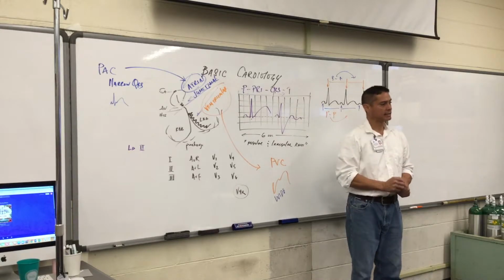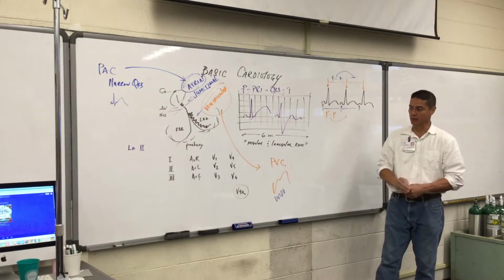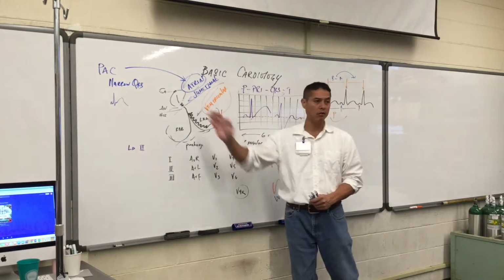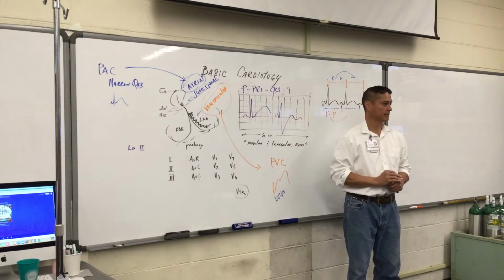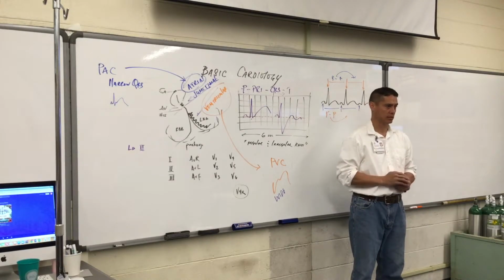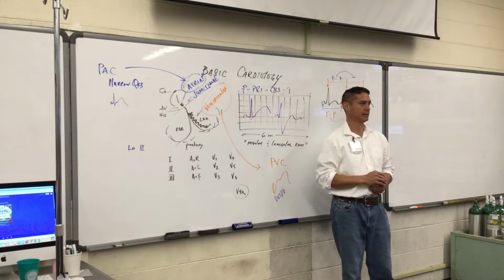All right, so the last thing as we look at these, and we're doing these criteria, and we have an early beat, either wide or narrow. The last thing to say is about differentiating between the early beats. One early beat will have a pulse that coincides with this contraction of the QRS complex, and the other one may not have a pulse.